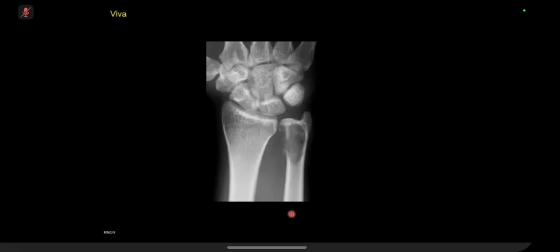Yeah, I think those are the most pertinent findings. Just looking at the rest of the radiograph, I can't see any other similar appearing lesions. So in summary, there is a lucent lesion in the distal ulna with overall, I would say, aggressive features, although there is a narrow zone of transition. In a patient of this age, my primary differential would include a giant cell tumour.